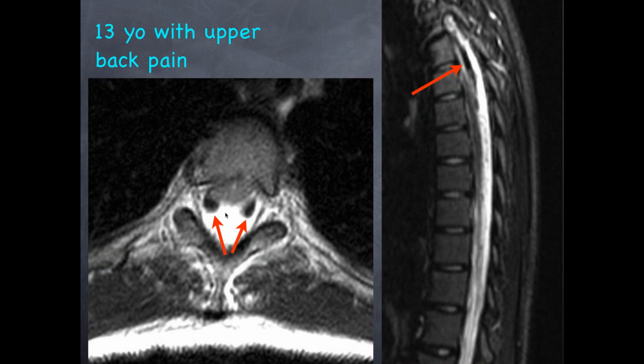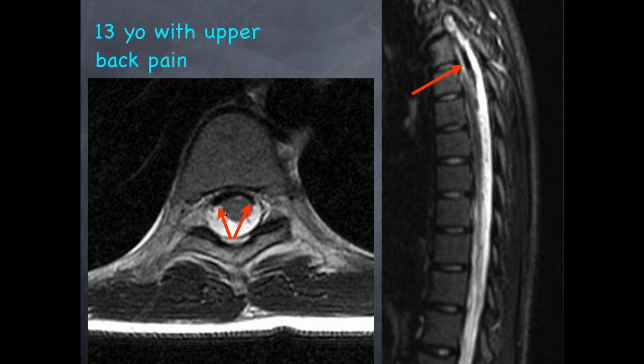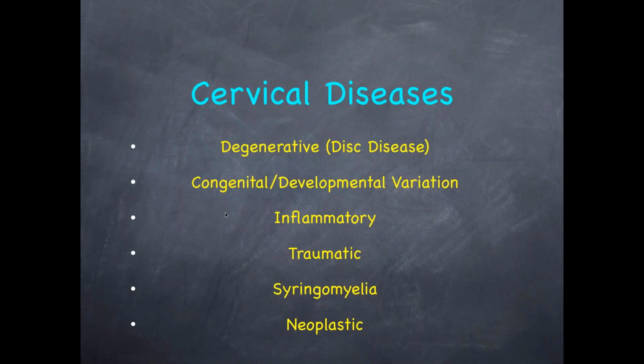So it's very much minimized in current technology from the way they do it. But just be aware that you can have a lot of flow effects here, which I still occasionally see from time to time. But it's not like in the old days when it was very obvious like this. Just be aware that you can get some funny flow things around the cord, especially in the upper thoracic and the cervical spine sometimes.